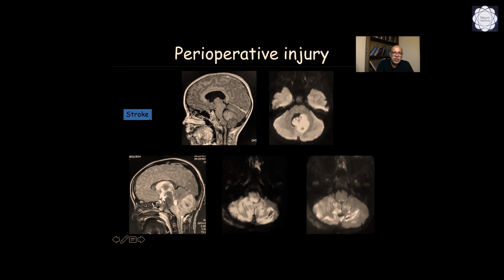Let's go to this case. This was a sad case because this was, again, a medulloblastoma. In this case, group 3 medullo with enhancement, restriction, a midline location. But in the post-op, the patient developed an infarct with infarction and hemorrhage at the lower part of the cerebellum with compression of the brainstem, and the patient did badly.